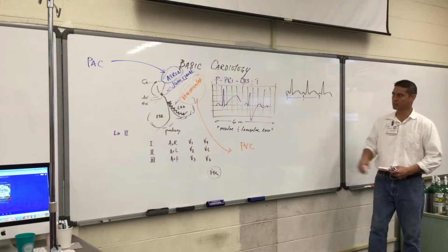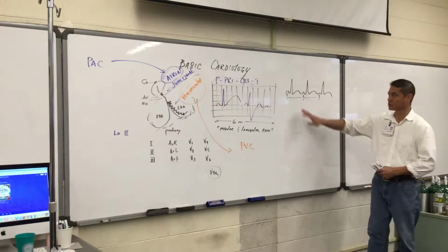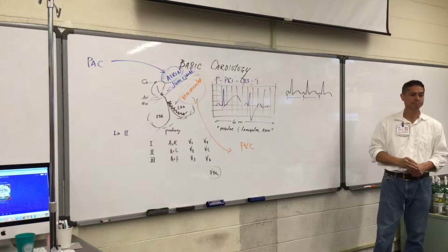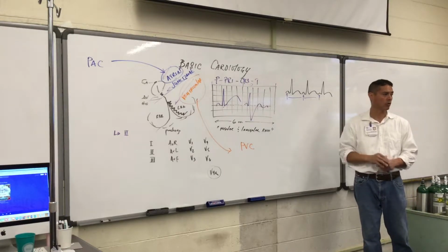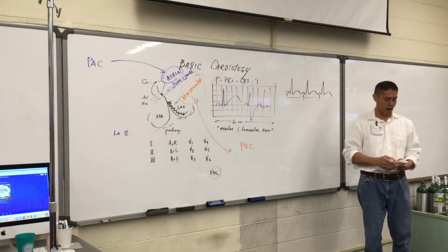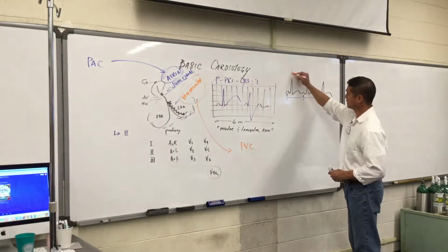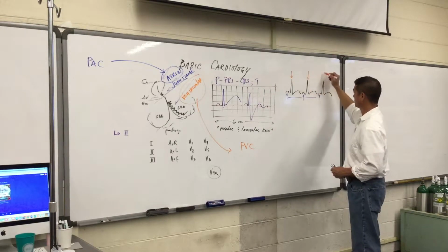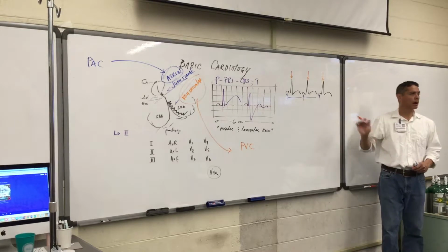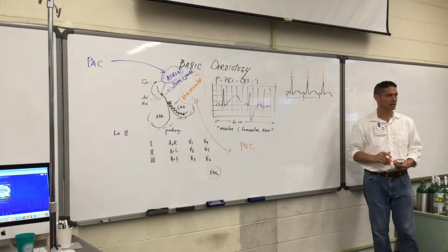The PR interval is pretty short. If it gets really wide, then we want to bring that up. But usually it's very short. Remember I told you the P wave is present, the PRI is short. Hardly noticeable. The QRS complex can be wide or narrow, but we have a QRS complex. And this is mostly upright, so this is a positive deflection. It can be narrow, it can go up and down. You can see obvious signs.